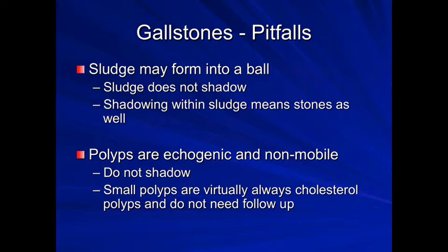Different protocols have different cut-offs as to what size polyp may need follow-up, but certainly a large polyp or a sessile polyp, or one that's got colour flow in it, is suspicious, because some of these may be neoplastic polyps and need either follow-up or removal to prevent them from developing into cholangiocarcinoma. However, most polyps that you'll see will only be 2 or 3 millimeters in size, and these are almost invariably cholesterol polyps, and so do not need follow-up.